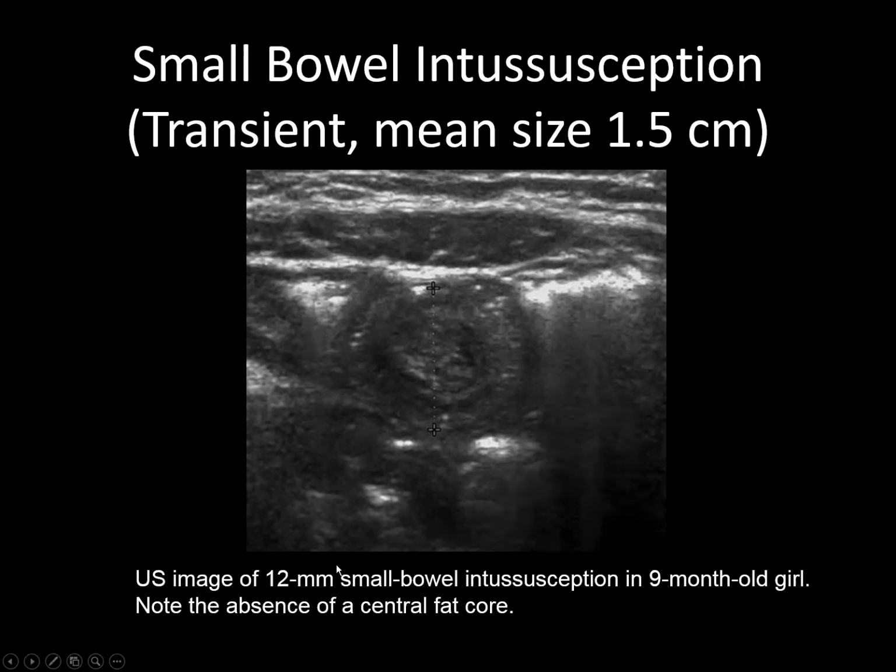This is an example of a 12 millimeter small bowel intussusception. No fat in this one at all, so it's not going to be ileocolic. And this one disappeared on repeat imaging.